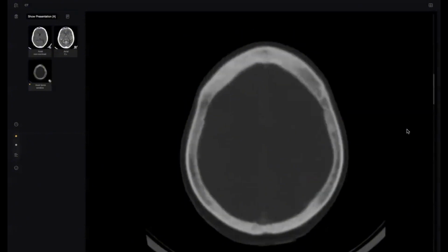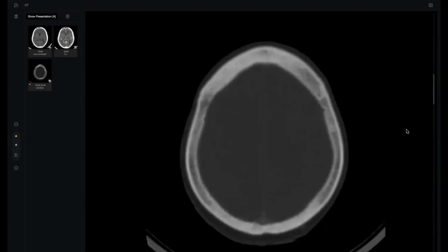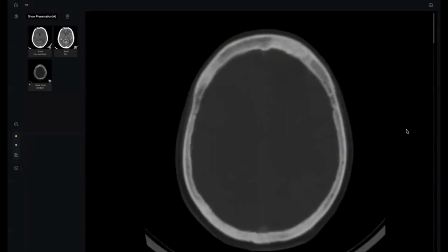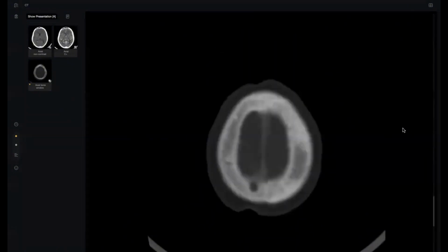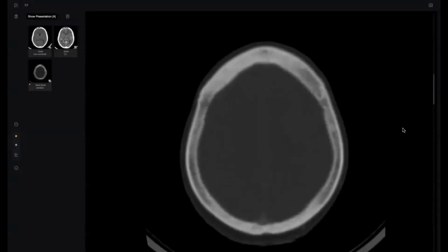In the bone window there is evidence of some sclerotic lesions in the bone as well, patchy areas of increased sclerosis. So keeping in view the radiological findings, I would keep a metastatic disease process at the top of the differentials, and would want to know the history of the primary. If there is any primary, I would tell the referring physician, and would further want to see an MRI of the patient.